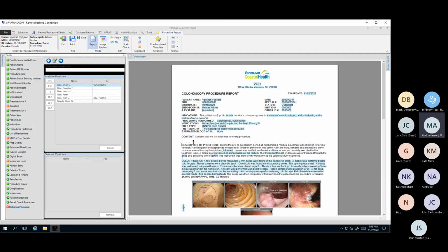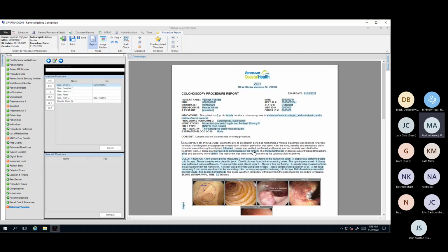If you're good with computers, you might be able to get away with it. But I have seen doctors play around with this in the past where they'll mistakenly wipe out the whole report, or it will start to have funny characters and therefore will not go over to center, or all the data they inputted will suddenly disappear.